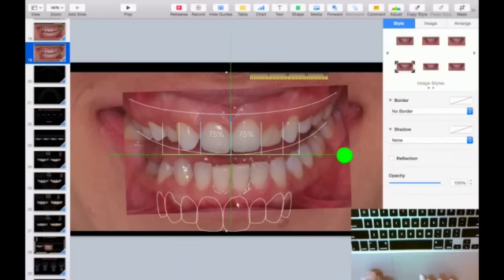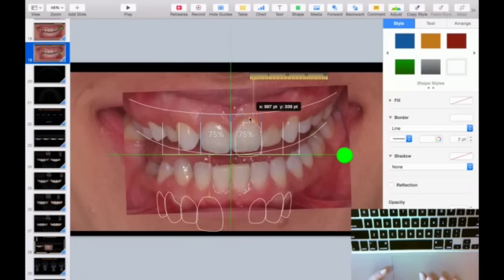I'm going to ungroup this and put my contour here. Hold the Command key, and place it there. And now I duplicate it and go to my menu bar and flip horizontal. And this one, I bring it to the side.